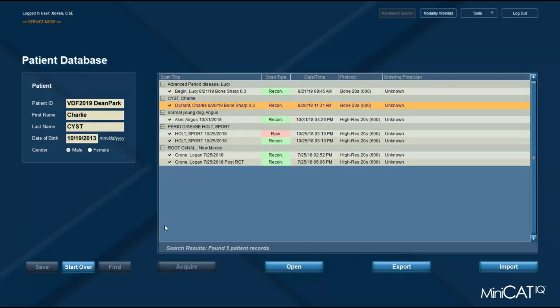I'll show you a relatively recent case. This is Dr. McTaggart in Canada. Probably one of her first cases. She had just started not too long ago.